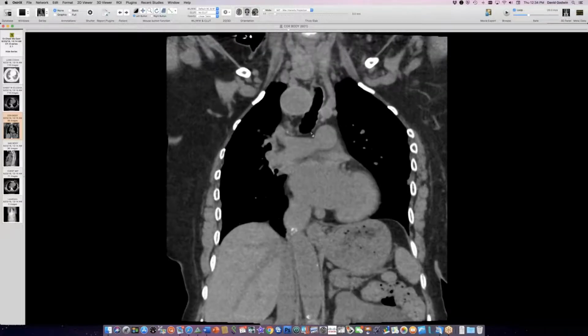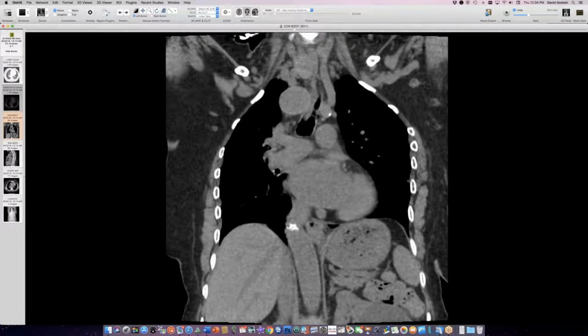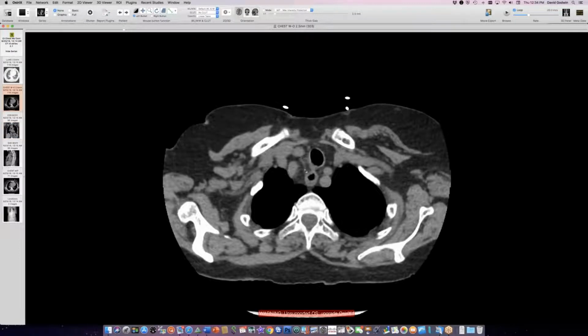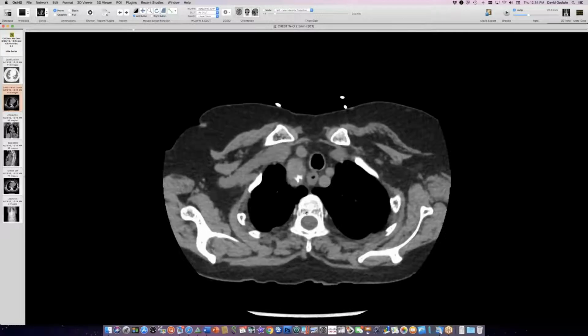And then you can see, if we go back to cross sections here, we don't have the world's best symmetry of the four vessels, the four brachiocephalic vessels in the upper mediastinum and lower neck, but it's reasonable. It's symmetry with a little bit of a tilt. So double aortic arch and a vascular ring in this person.